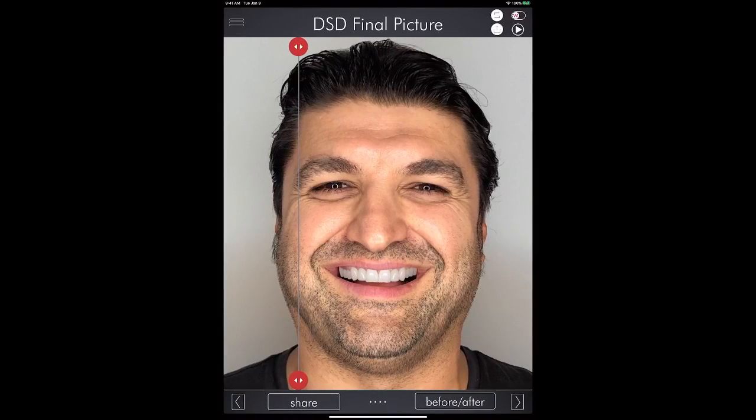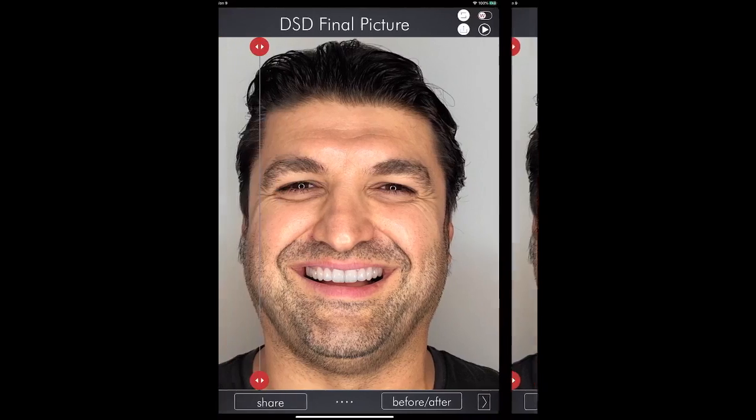Or I'm gonna go with Kyle Stanley smile. Again, edgy smile, right? Now it's very easy to just scroll through the 3 versions of the smile design and let your patient decide. Involve the patient in the discussion, ask about his expectations.